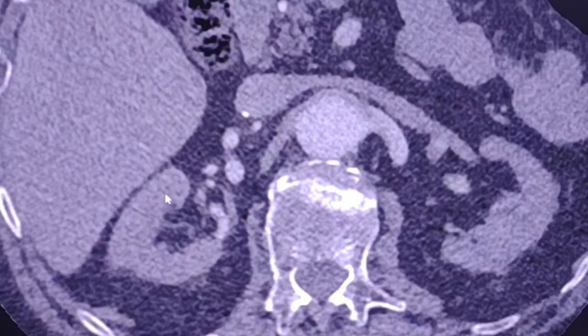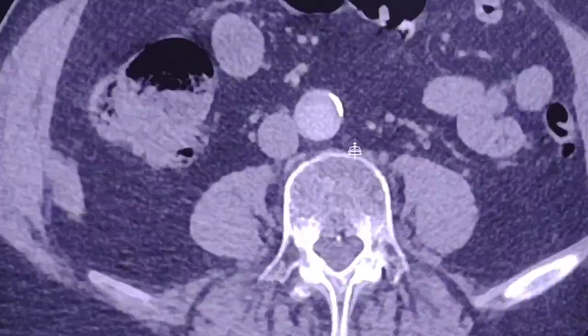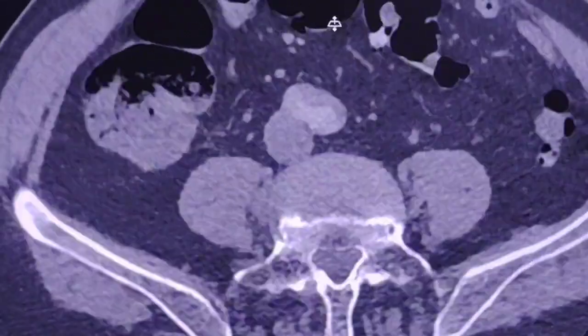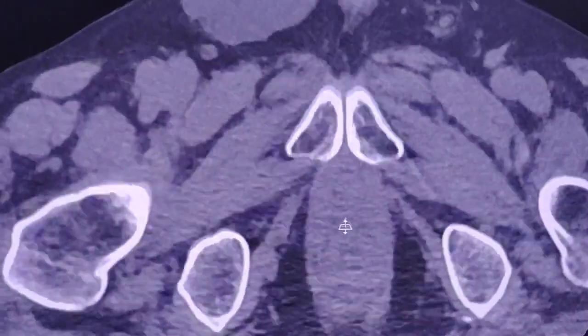And if you see, the renal parenchyma bilaterally shows less opacification and enhancement than expected. Another problem here is that the opacification of the aorta is significantly reduced beyond the bifurcation. If you can see, this is an arterial phase, and there is a reduced opacification of the arteries.